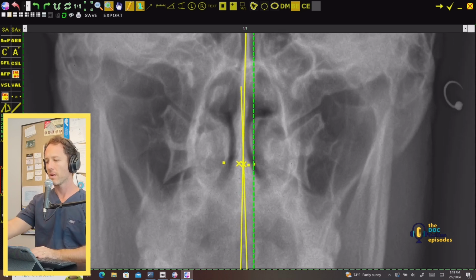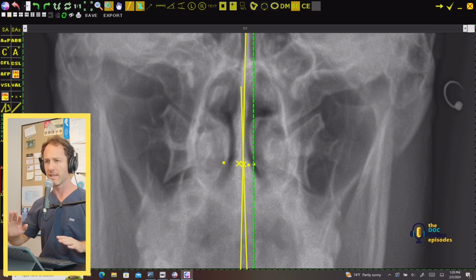Within advanced orthogonal, you're not just going to drop an atlas plane at the posterior arch and lateral mass inferior junction, which is typical with the orthogonal procedures. You're actually taking the entire atlas in and looking for consistency in references. And so they call that majority rules.